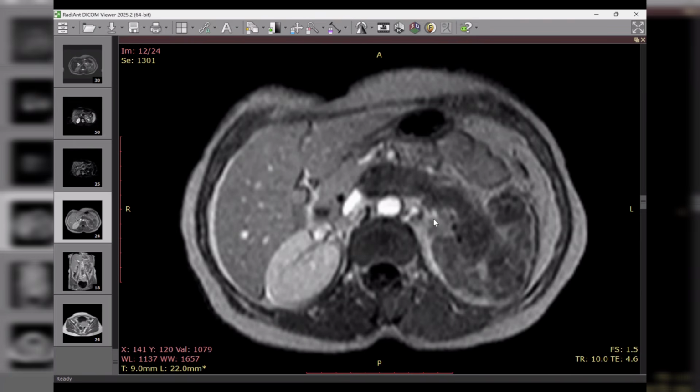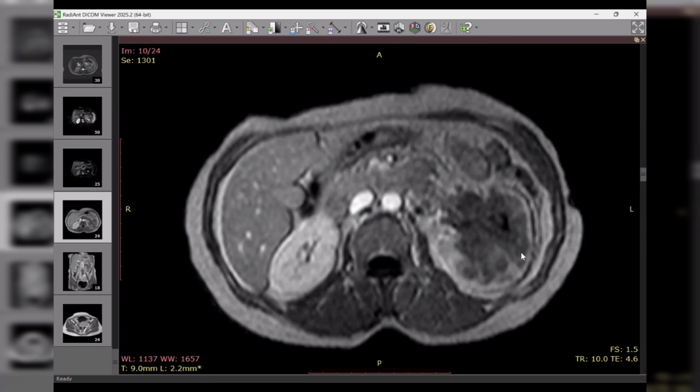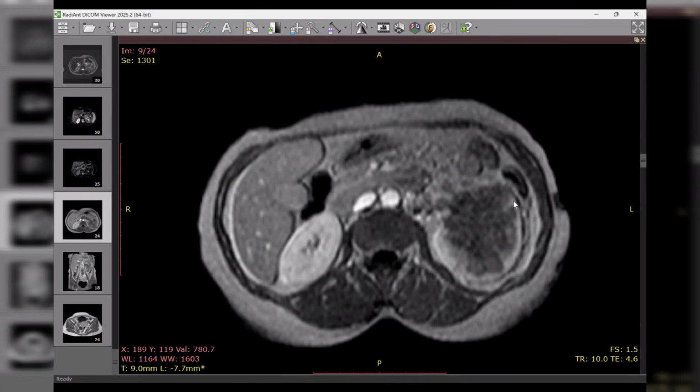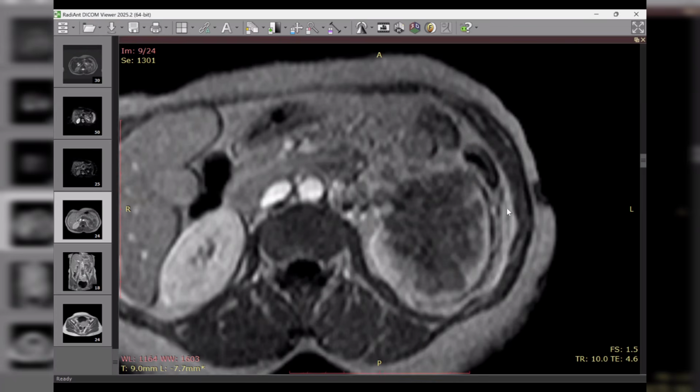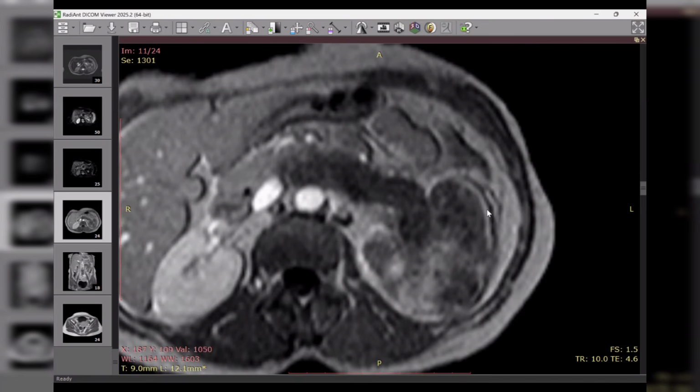So I will check for the diabetic state of this patient, and the hypercoagulable state of this patient. Actually, I still remember this patient, she had antiphospholipid antibody syndrome. That was already stated in her clinical text. So with still preservation of this beautiful cortical rim sign, if I had a malignancy, it would distort everything. It would not preserve the cortical outline. It would be exophytic, especially as it is a large mass. But I still have some enhancement of the cortex. You got my point?